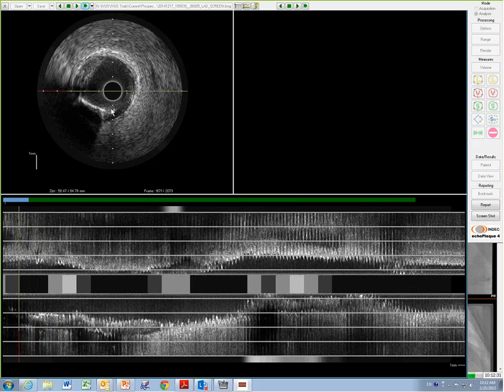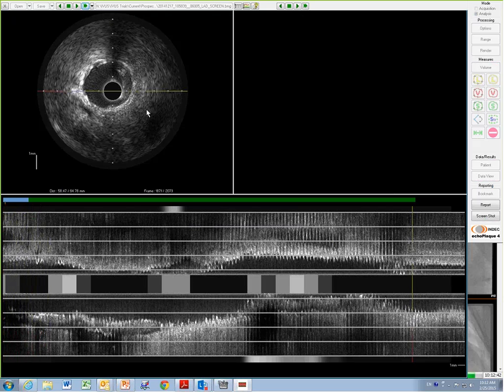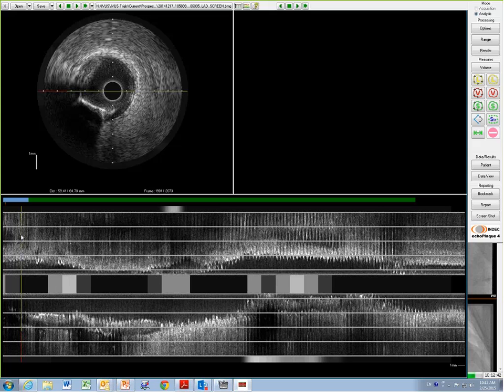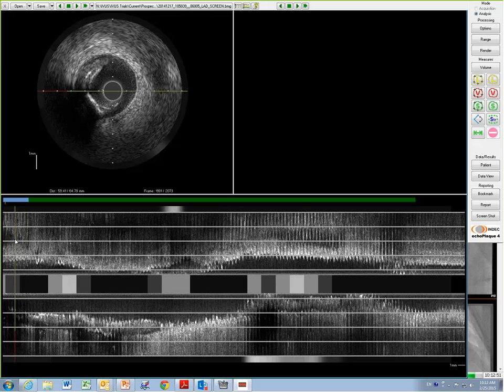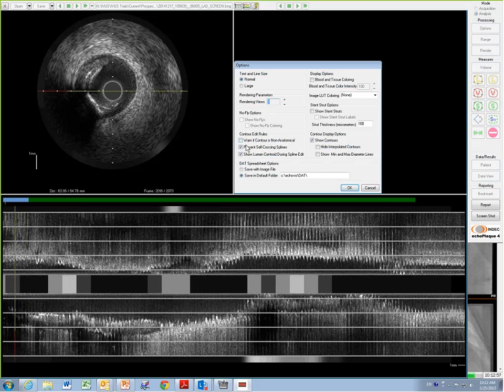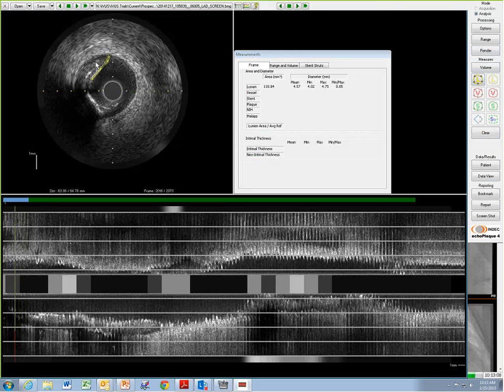And then, can you recognize something here? Yeah. This is dissection. And actually, I think that is reaching to the media. So probably this picture is the best one, right? How does the dissection look if I draw it exactly? The dissection flap is like this. Yeah, I agree. Like this, the media dissection here, and then this is a flap. Yeah, I mean, this is perfect.